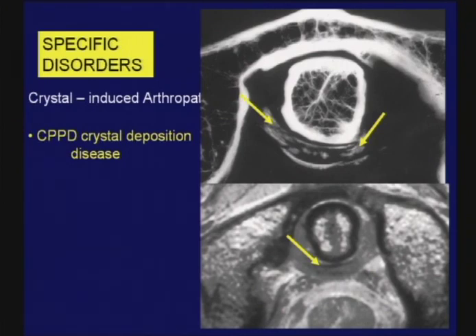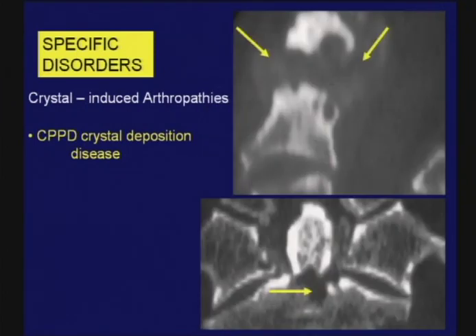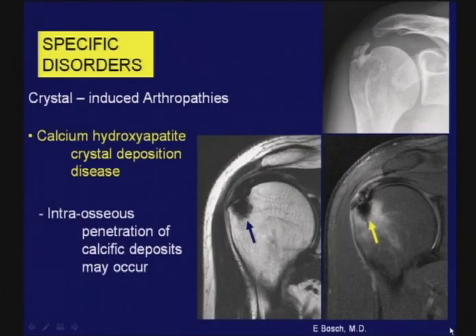And what we have found in this location is because these deposits affect the transverse ligament, and that ligament is intimate with the posterior aspect of the odontoid process, these patients are prone to develop odontoid fractures, even with minor injuries. And here's an example, taken from several that we reported, of pathologic fracture through the base of the odontoid process.